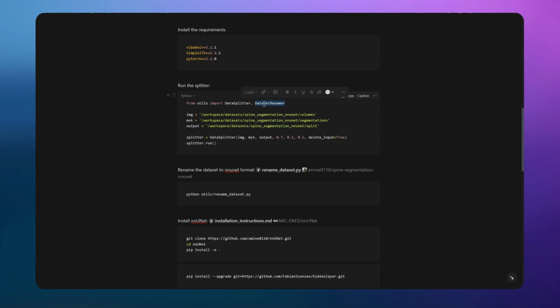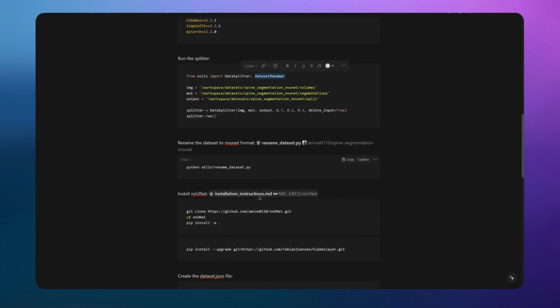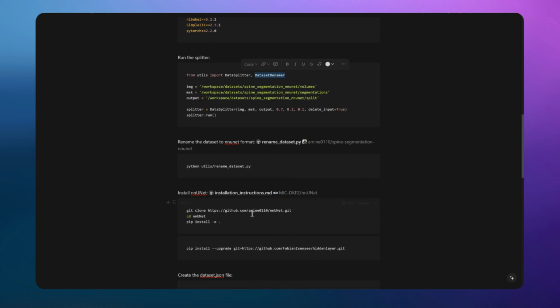in our course. So I will run it and show you what it will generate. But for now I am just going through the workflow and showing you what we will do. But after that, you will see that all the steps are easier if you have everything set up correctly. You don't need to care about that. Everything will be easy to run your training and to get your model and do evaluation. And after that, you can do whatever you want with the model.